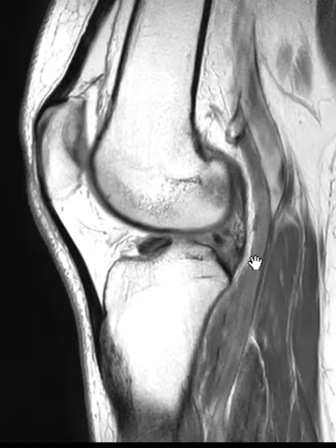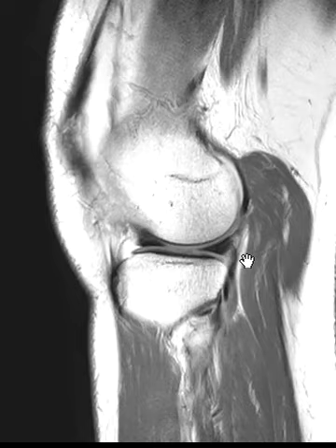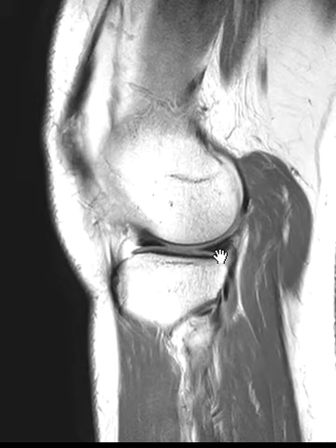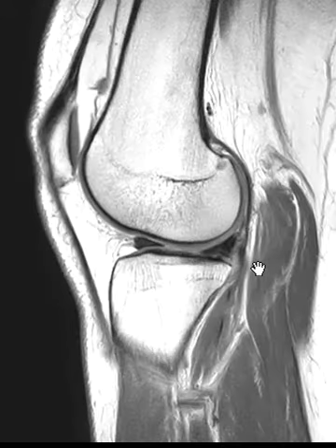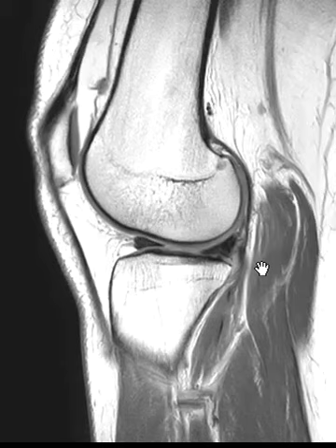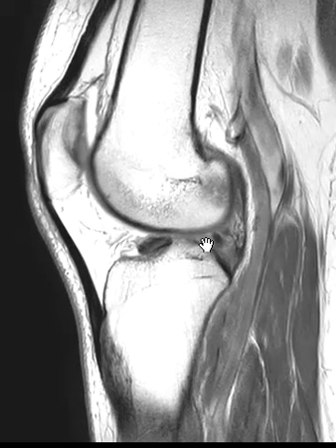And there's one other finding in this patient, which is their lateral meniscus root. At least several of their findings, but the one I want to show you. So this is a sagittal PD image. Here's the anterior horn, here's the posterior horn. And we're going to follow that lateral meniscus towards the center to see the meniscus root. So we're getting closer, and on this view, between here and here, we see there's a loss of the dark signal right there, and then we see nothing here.